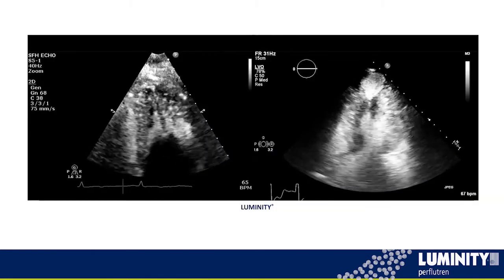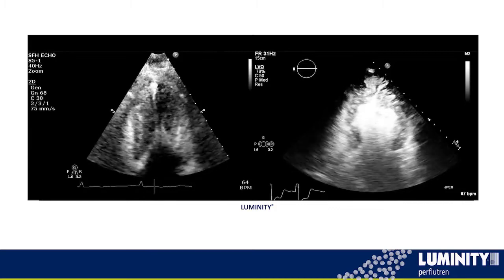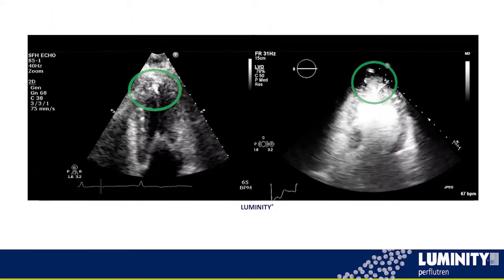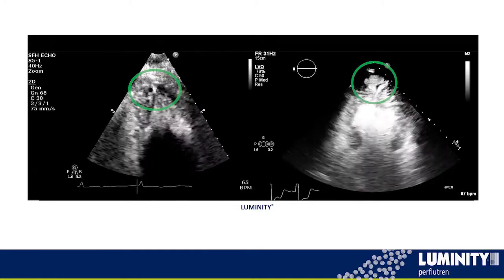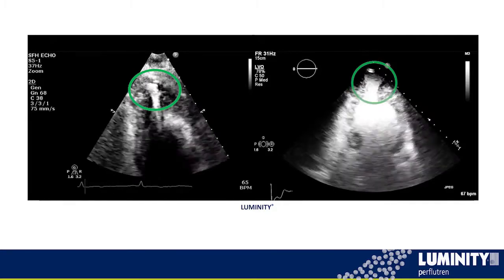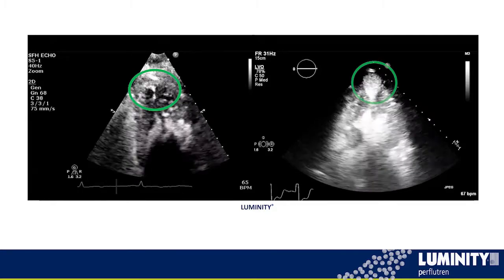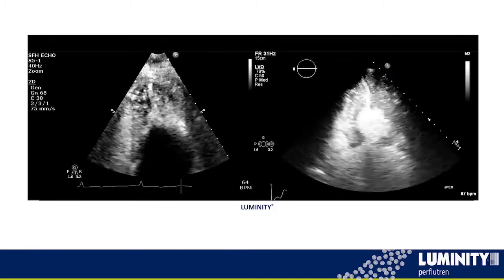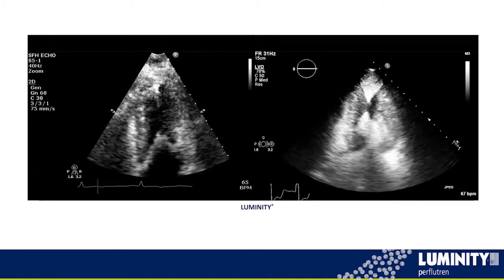With apical hypertrophy, it's important to note, even if you know the patient has apical hypertrophy, we want to make sure that we see that very tip of the apex. These two examples kind of show sometimes the progression. They can have a little outpouch or a little aneurysm, which can develop into these big aneurysms, almost looks like a pseudoaneurysm. And when they do have these aneurysms, number one, it's important to find it, because these patients are at a higher risk for sudden cardiac death, so they may put a device in. But also, it's important to see if there's a thrombus in there.